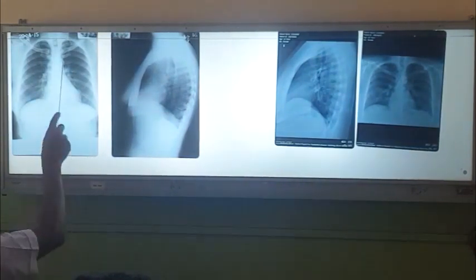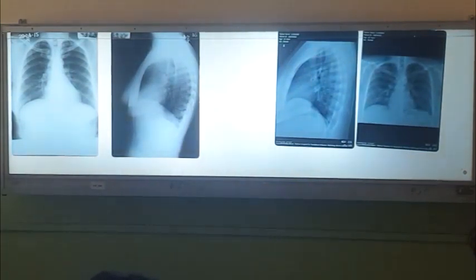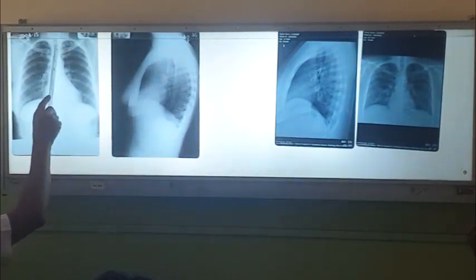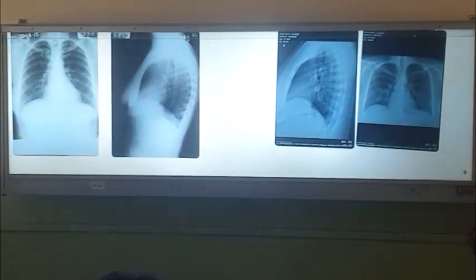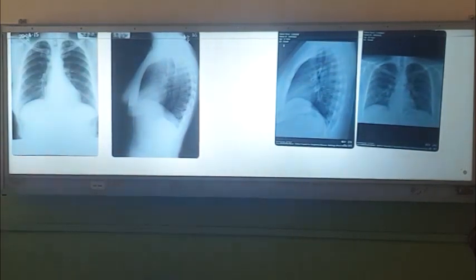And then this area is called the aortopulmonary window. In patients who have hoarseness of voice, always look at this point, because the left recurrent laryngeal nerve comes around this aortic arch, right? So lesions here will catch that. So the aortopulmonary window you have to look for, right? So that is about the normal appearance.